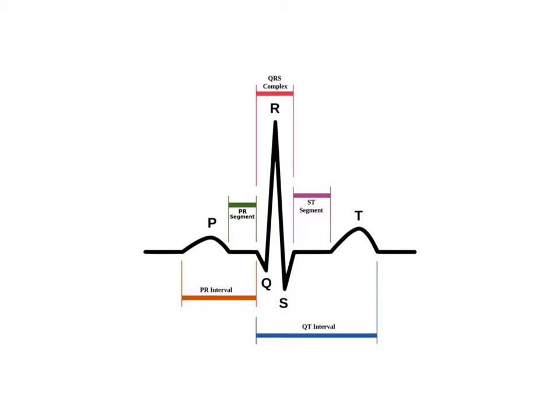What I wanted to cover today is intervals and segments and defining those properly, both of which are going to help us identify little events happening on the heart, and overall give us a picture of the patient's heart condition. Okay, so let's start with one particular term here. If you look, you see two segments being defined there.